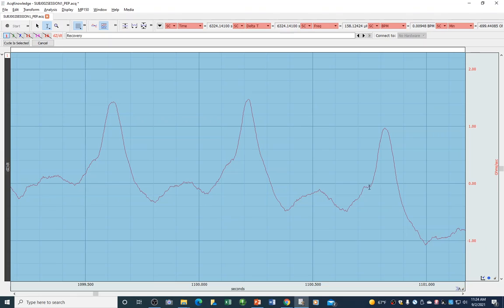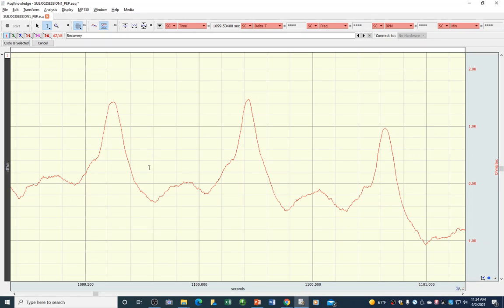If I take a real simple example, it's going to have more trouble figuring out where it places the B point on this one or this one. So I'm going to go with this one here. And I'm going to put my cursor close, but not there yet. And then I'm going to keep ticking. I'm using my right arrow key on the keyboard to tick one at a time. I think the one right before that was a good starting point.